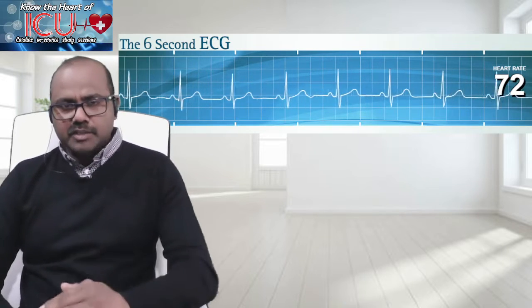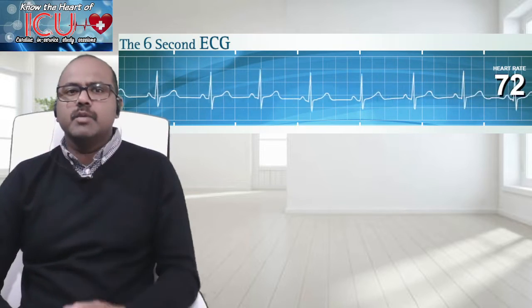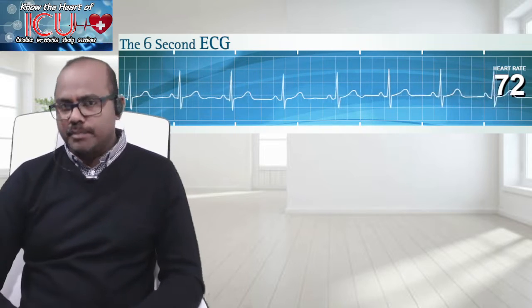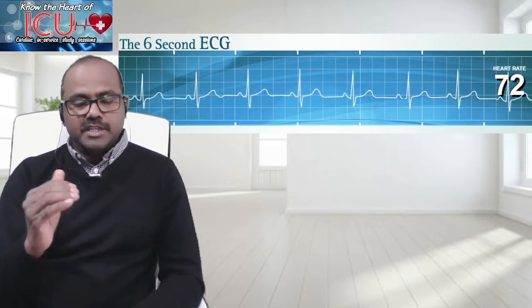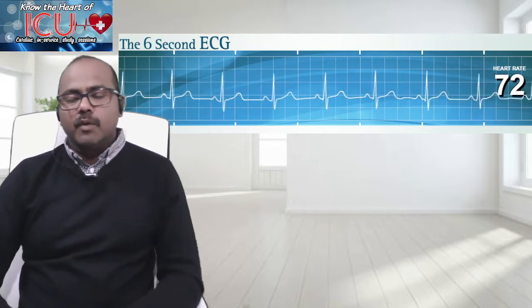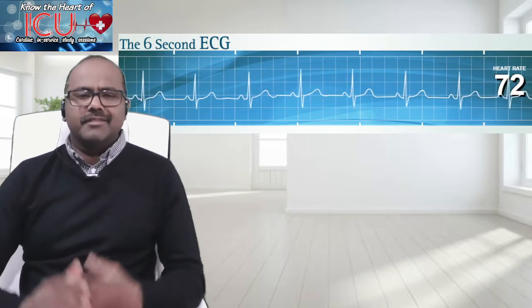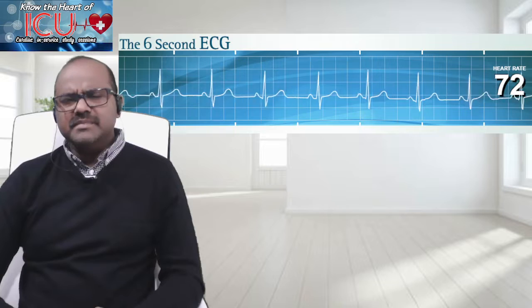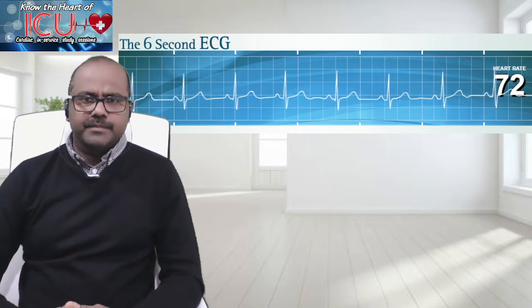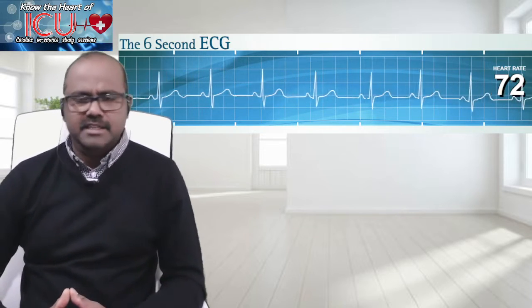And if the impulse originates from the ventricle, the classical sign is a broad, bizarre QRS complex. In that case, you have your premature ventricular complex or PVC, you have your ventricular tachycardia. If there is no pulse, that's a cardiac arrest scenario, and you have your ventricular fibrillation, always a cardiac arrest scenario, and you have your idioventricular rhythm. That means a very slow agonal rhythm originating from the ventricle. So these are the usual dysarrhythmias you find in the clinical setting.